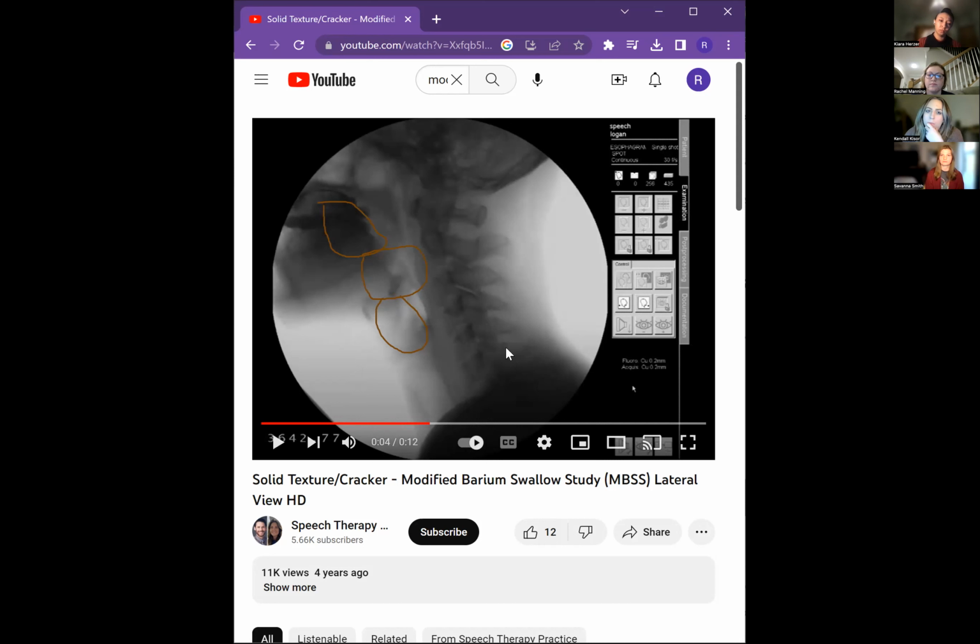Okay. And so in that image, where are my vocal folds exactly? So that's a good question. Let me show you. I will circle them so that you can see. So your vocal folds would be this slightly darker area right between this lighter area down here. So it'd be right around here. Okay. So that's the part that we wanted to avoid. Mhm. Okay. Can you see my esophagus in this image? So your esophagus starts right down here, and then it goes down a little bit further. So we do get to see a bit of it.